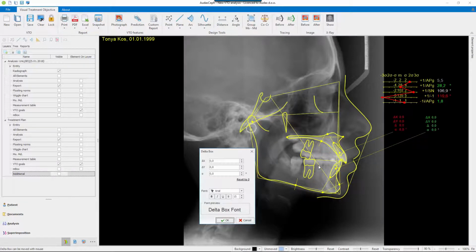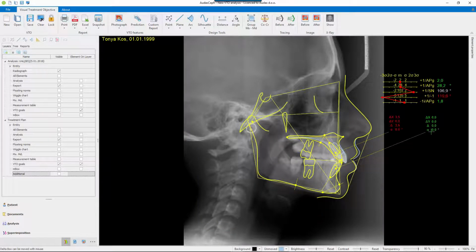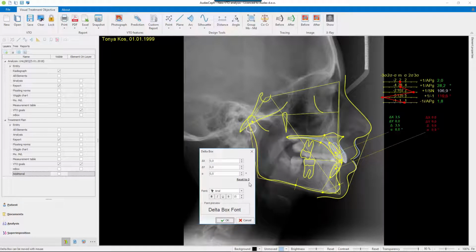I'm going to double click and place this one backwards, and you can see when I place that backwards, those measurements change. And I want to do something with this one. Also, I need to send it back, and you can see what are the changes right now.